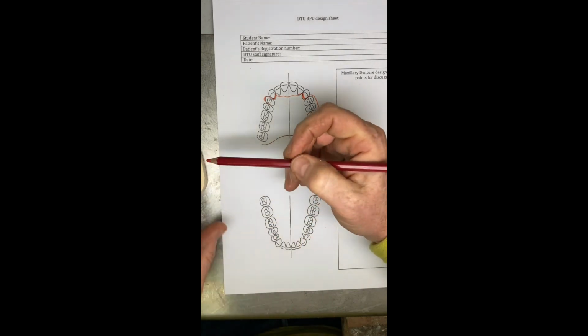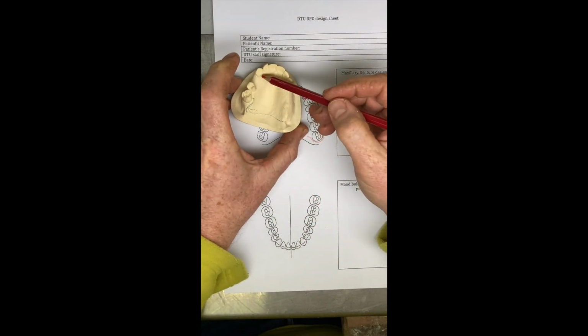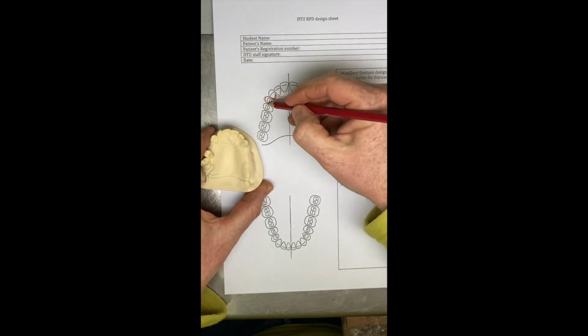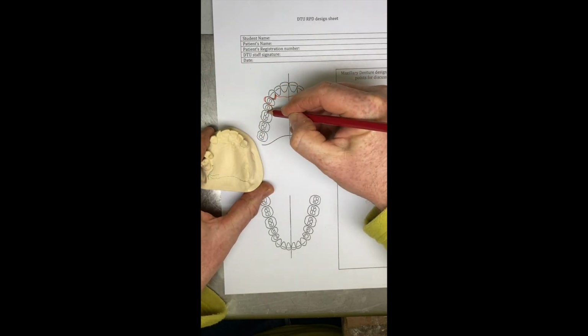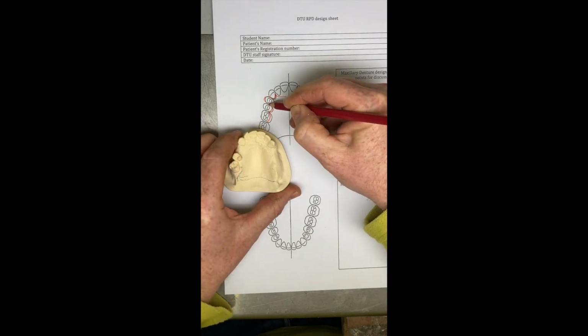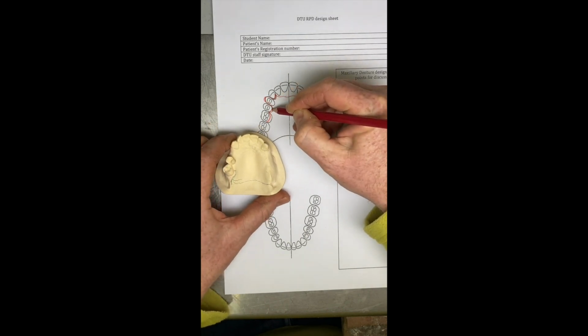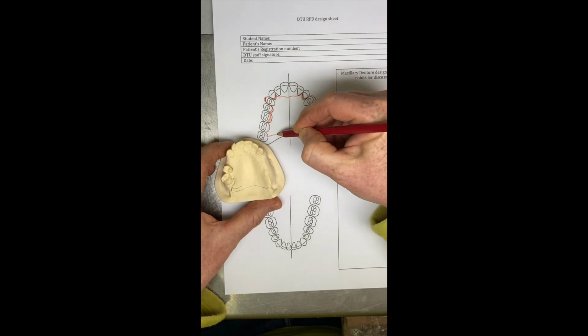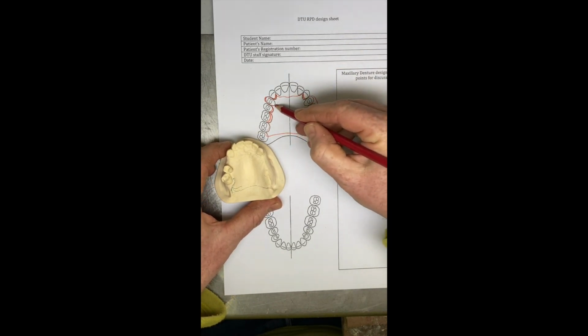And then on this side of the arch, we'd probably want to come around both of these abutment teeth up to and above the survey line with our acrylic. Again, I'll just draw it onto that 6 to make it a bit easier to see. And then again, a nice big footprint to the denture.